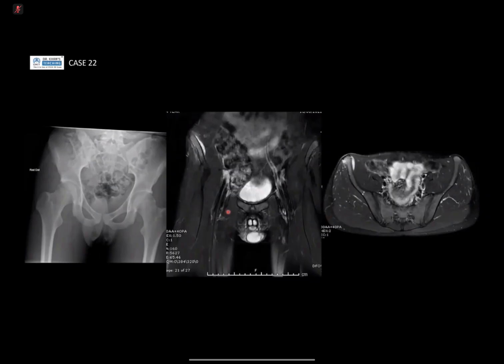So an avulsion fracture, you can see, is in an older child. Growth plates are almost fused. The main thing to note is that in kids, you need to know all your sites of potential avulsion fracture. What you look for is the asymmetry between one side and the other side, making sure it's a properly centered radiograph. And this one it was, but I think the orthopedic surgeons just wanted further clarification on how it looks, and hence we got a nice image for teaching.